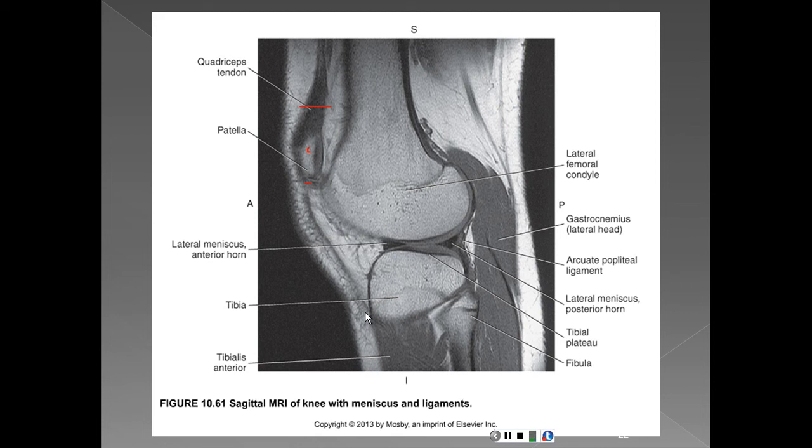Because you have a tendon, the inferior patella tendon. And as you flex this knee, it pulls this patella down, which could snap this quadriceps tendon and make the patella ride real low. Okay, so you want to make sure that you see the quadriceps tendon attached to the patella, and the inferior patella tendon attached to the patella.